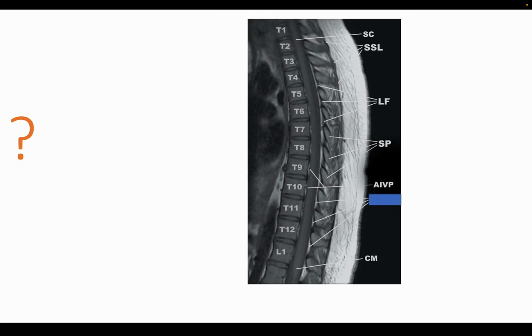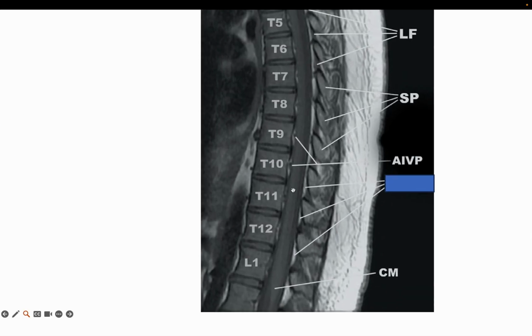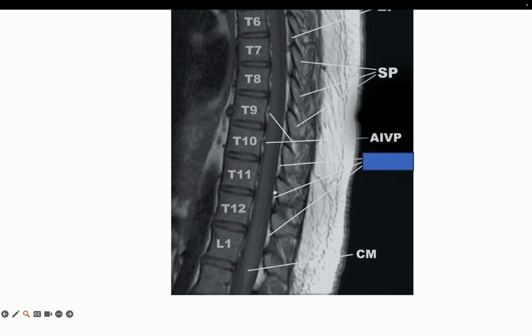Okay, so this is a T1 image, as we can make out the CSF is hypointense over here. In any image, T1 or T2, ligaments will always appear hypointense. As you can see over here, the ALL is hypointense, the PLL is hypointense, the ligamentum flavum is also hypointense. But fat is going to be hyperintense on T1. As we can make out, the subcutaneous fat is thoroughly hyperintense over here. So this is the interlaminar epidural fat pad. As we discussed, it is quite obvious in both thoracic and lumbar spine.